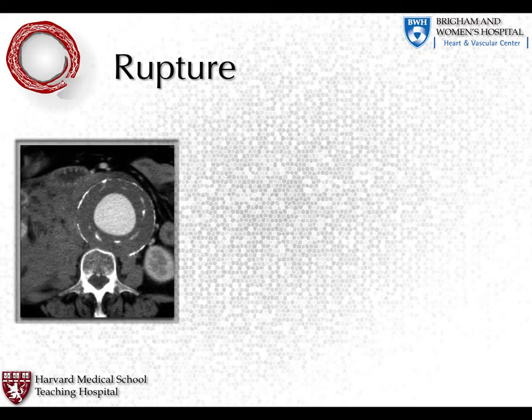Okay. Question about that. Yeah. I think logistically, I'm having a hard time differentiating ulcer-like projection from penetrating ulcers. If you have an IMH, so don't even think about ulcer-like projection unless you have an IMH, and it's on the surface of the IMH, and it's the secondary process. PAU in association with the IMH is the primary process. So the epicenter of the IMH should be closest to where that ulcer is, expanding out from that point.